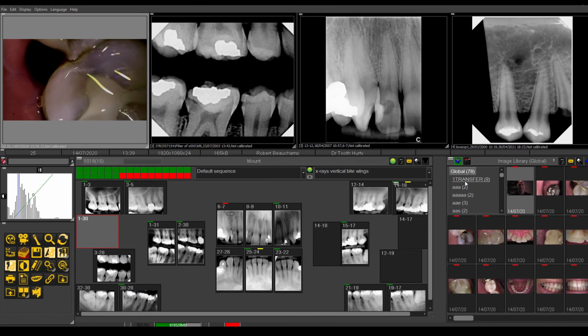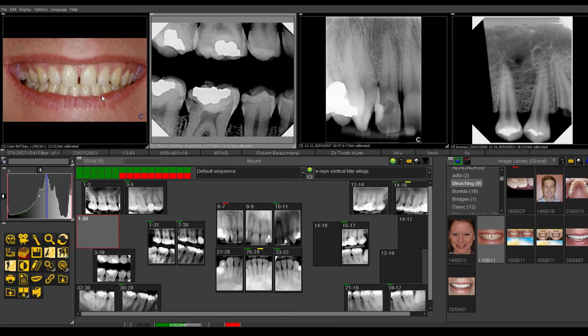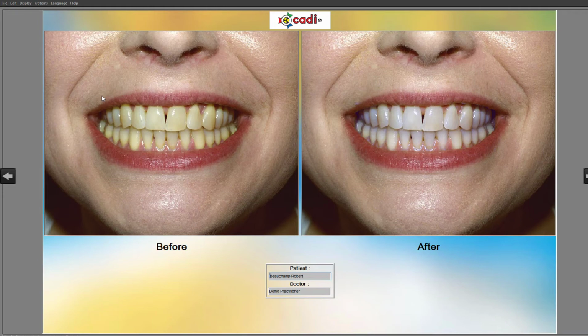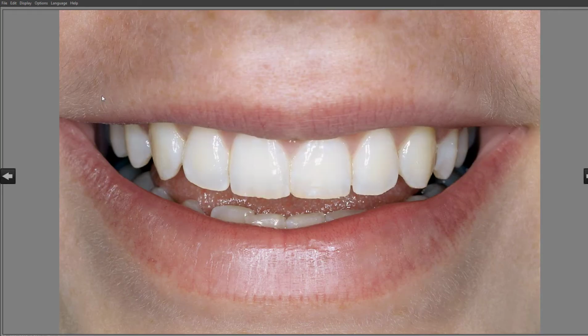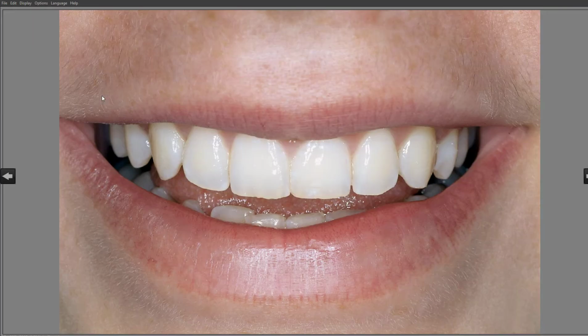So when you are showing possibly some of the treatments that you'd like to be showing, like if you did want to show maybe some whitening that you've done, well, you can double click and you can show the patient some of the whitening treatments that you've done to enroll them for some type of whitening treatment or bleaching in office or take-home systems. And that's where we can see the before and afters, of how the whitening has an impact on the smile.